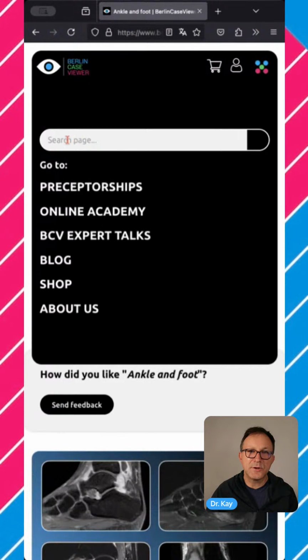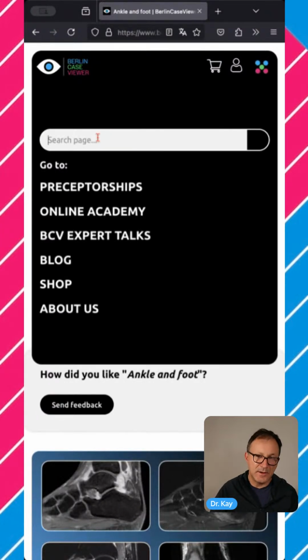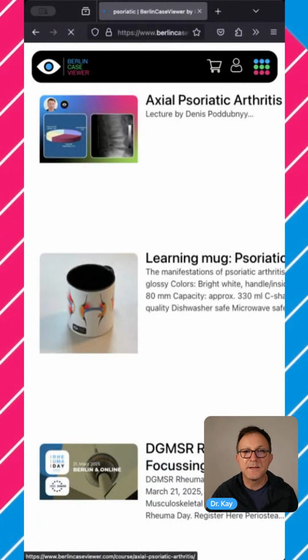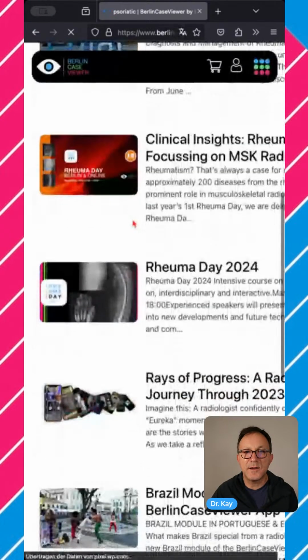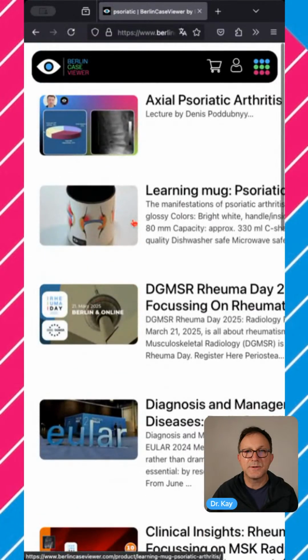You can even search. If you open the menu and search, let's say, for psoriatic arthritis, and press enter, hopefully it works. Yes, you can see all the things that we are providing for psoriatic arthritis. We have a lecture on psoriatic arthritis.